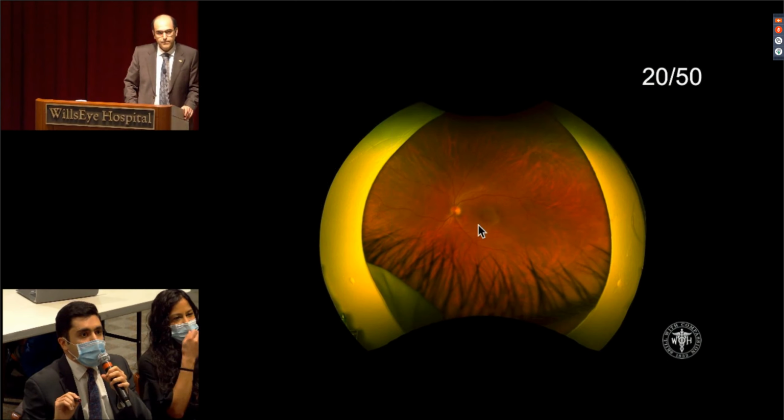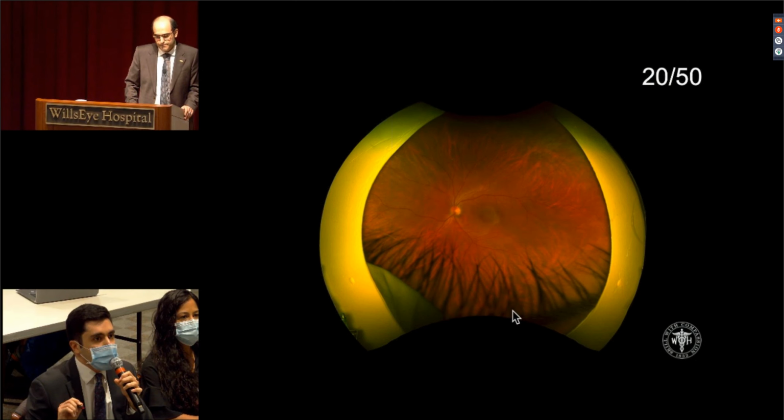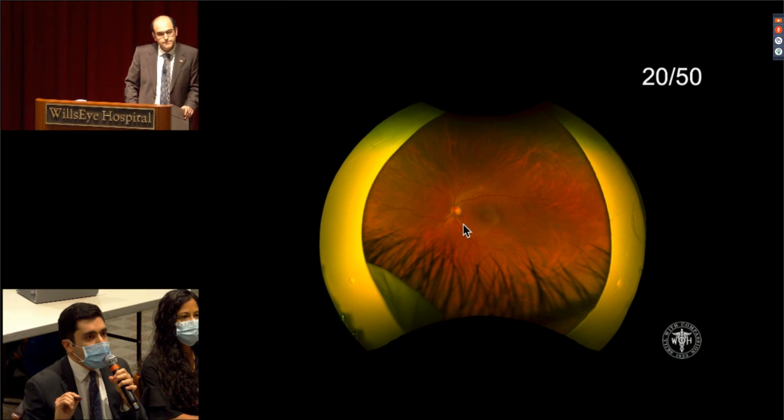Same imaging modality of the left eye. Once again, vitreous grossly clear, but trace cell as noted before. Here we see more of a blurring of the disc margin, almost 360 here. And once again, these perivascular, maybe even here, periarterial hypopigmentary change along the superior arcade, supratemporal arcade.